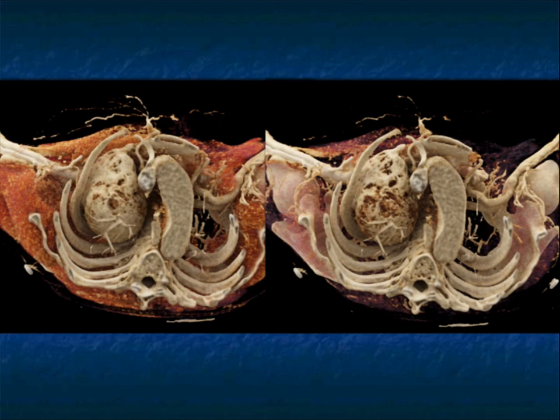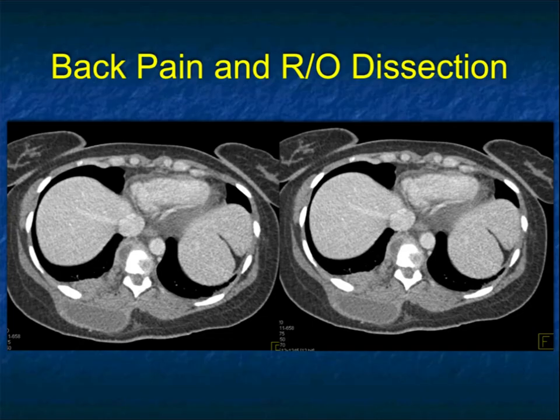Mass effect. Again, if you don't think about fibrous dysplasia, usually we see a small rib lesion, mild expansion, or some changes in the pelvis. But this is kind of a really impressive example of fibrous dysplasia. Now, the next thing I want to talk about is some of the processes in the posterior mediastinum that cause mediastinal widening. But let's stop right here. Let's take a break, and let's come back in, let's say, 5 minutes. Let's get some coffee, and I'll see you then.